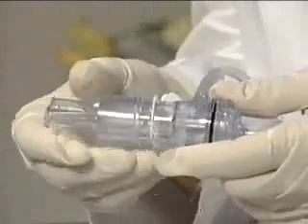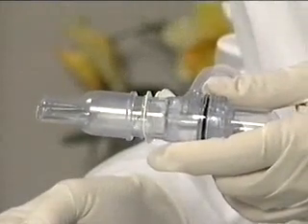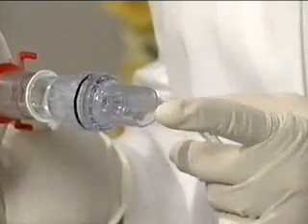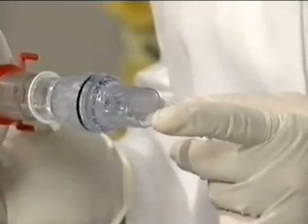Attach the mouthpiece or face mask to the rounded end of the device. The serrated end should be exposed to ambient air at all times. It's important to remember not to occlude this end. Finally, inspect the device on a routine basis to ensure its proper use and function. If damaged, it should be replaced immediately. Verify that all connections are secure.